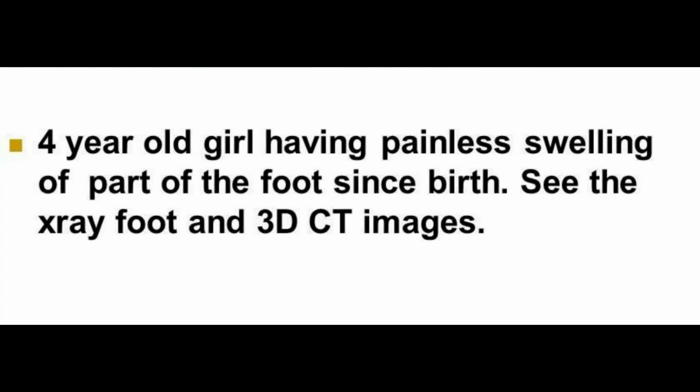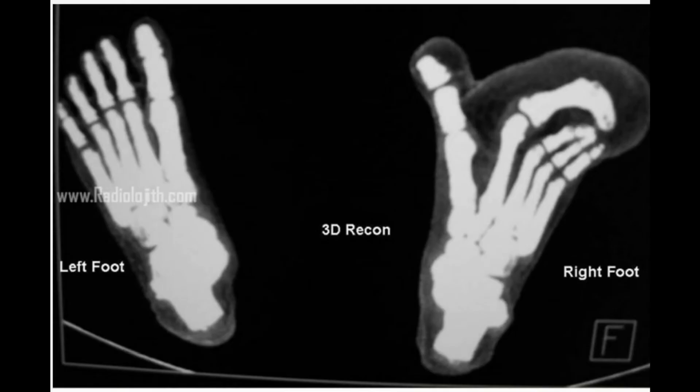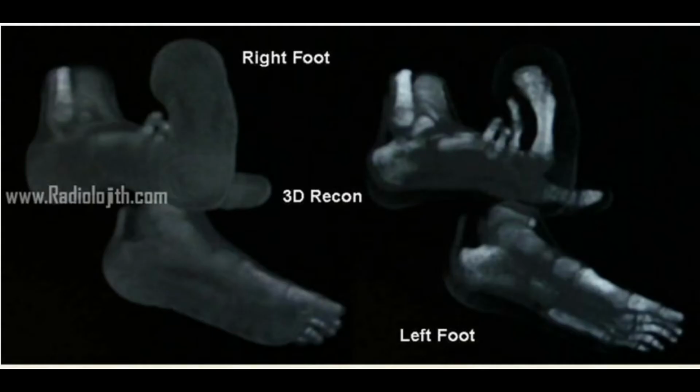This is about a 4-year-old girl having painless swelling of part of the foot since birth. You can see 3 images and give the diagnosis. The first image is an X-ray of the right foot in AP and oblique views. The second image is a multiplanar reconstruction of both the feet. The third image is a 3D reconstruction of both the feet.